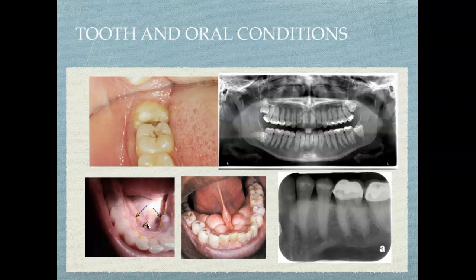Not impossible, but very challenging. So we have small mandibular tori in this photo and a very large mandibular tori. Remember that tori are bone, and they are not quite as dense as some of the other bone that we have, or I will say in this particular case.